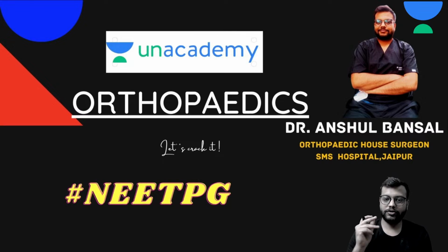Today's class is focused on NEET PG 2021, that is on 12th September. Only 5 days are left. In today's class we'll study about all the x-rays of the lower limb. So it will be a rapid revision type of class जहाँ पे अपन x-ray देखेंगे and उन fracture से related जो important चीजें होगी I'll just tell you, but basically it's for the x-ray identification wali cheese. Okay, and very important, it is a rapid revision session.